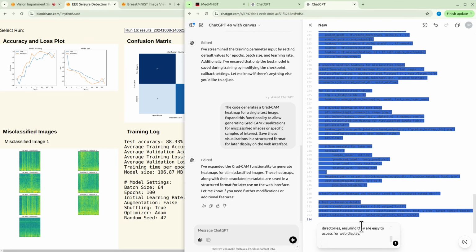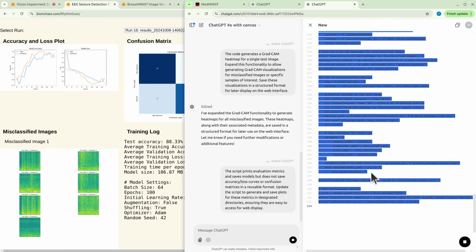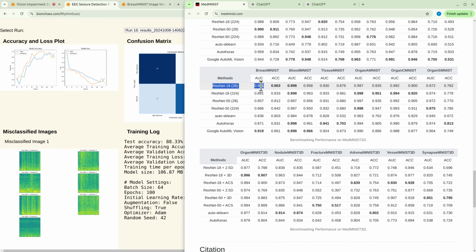Just need to do another round of training. We did 2 training runs already. We got like 0.7 or so, as opposed to 0.9 for area under the curve. So we're trying to improve the model performance. We have apparently a much simpler model than ResNet 18.